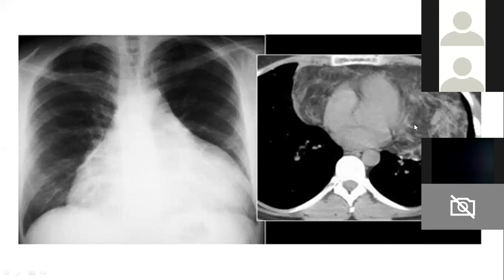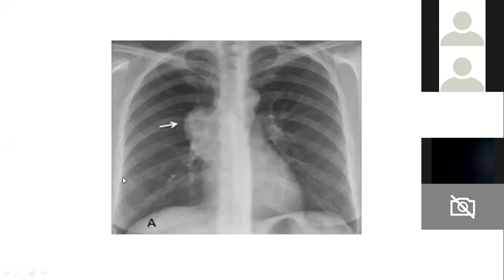This is again taken from one of the articles published recently. So it need not always be a cardiomegaly, right? That's one thing I learned from this. And we should always think of an anterior mediastinal mass also. So better do a lateral view at least to know what is happening. And again, this is the importance of understanding the silhouette sign.